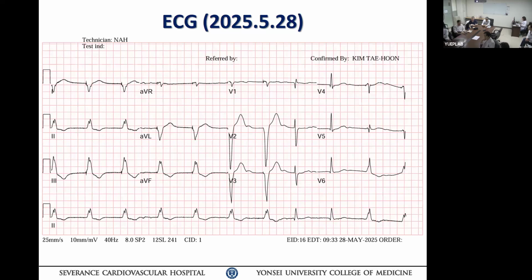So therefore, your differential diagnosis is going to be: the atrium could be standstill or dissociated, but we cannot see it because maybe it is falling into the QRS complex, so it is not manifested on the surface ECG. Third would be atrial activity so chaotic, as Dr. Park explained about the wave dynamics of atrial fibrillation, that your wave pattern is changing constantly, but it looks noisy, okay? Especially if somebody has been taking anti-arrhythmic drugs.